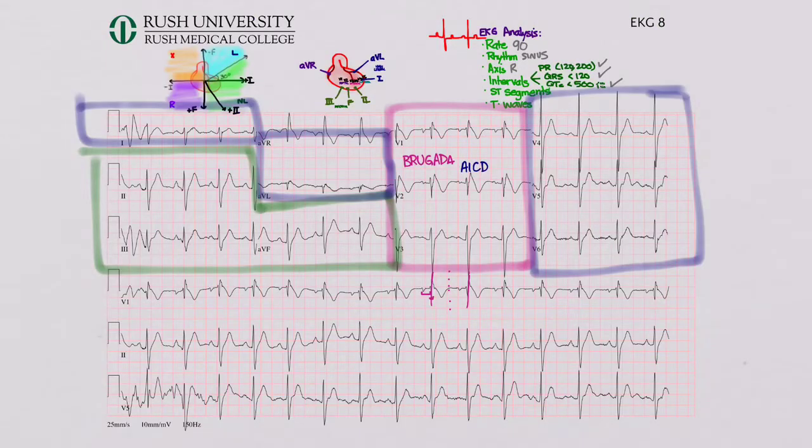So this patient, I would say it's sinus rhythm with a Brugada pattern, and if worried, should get a defibrillator, so it should probably be evaluated by cardiology further, unless they're coming in with symptoms, then sooner than later, so they don't have a sudden death. Okay, next EKG.